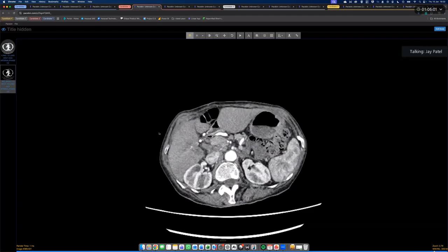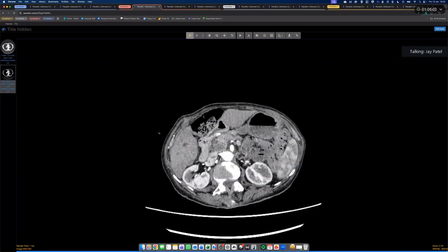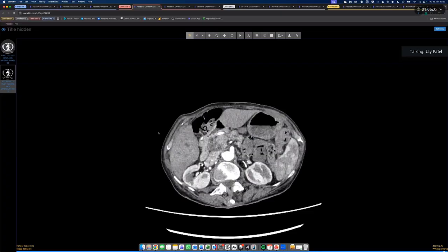just quickly say that you've seen it. I've noted there's also an abnormality in the liver. I'm going to more specifically assess the chest. After all, this is a chest CT, right? The purpose of this examination is to evaluate the abnormality on the X-ray. Shouldn't get sideswiped or distracted by things we see off to the side.